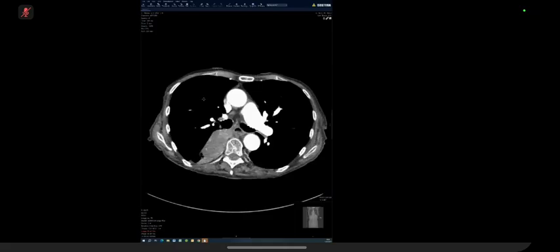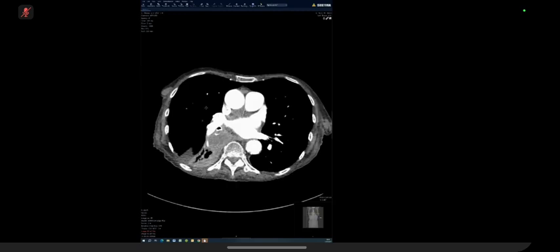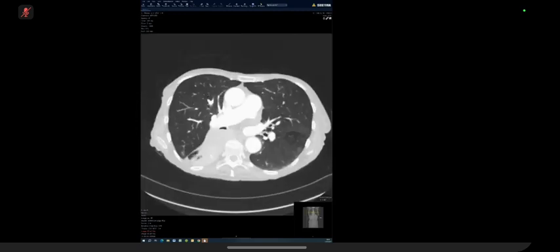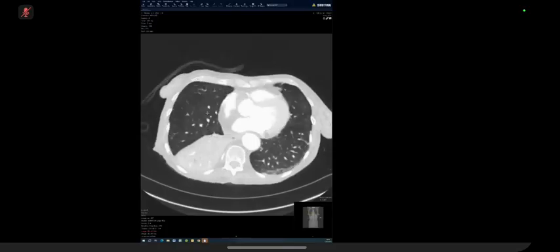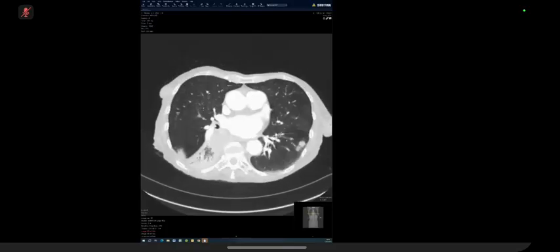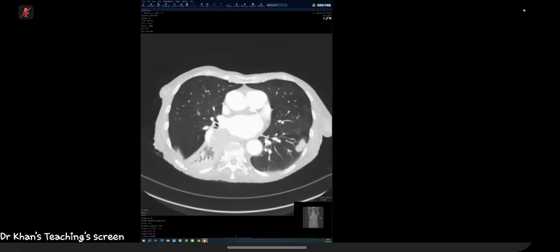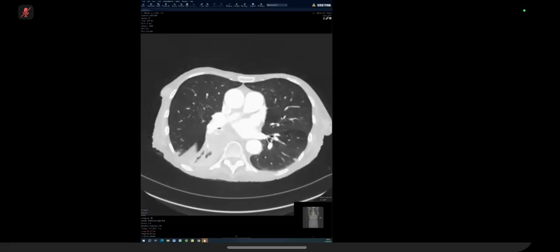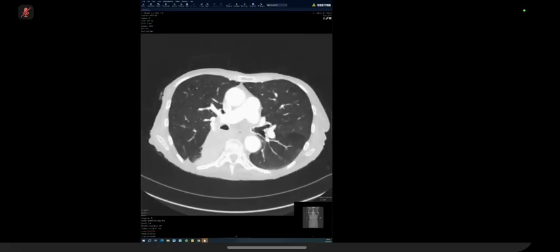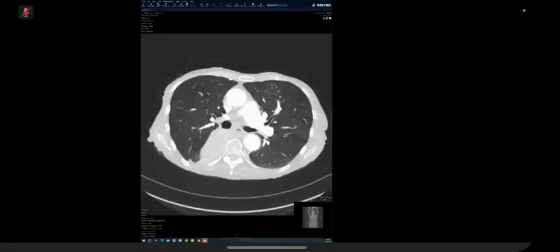So we have spent a little over 7 to 8 minutes, and this is the point where the examiner will start rushing you to get a call out of you and next steps. So give me your conclusion of it, and then I'll go through the case again. Okay. So in summary, I would say that this is a right lower lobe consolidation with a cavitating lesion in the left lower lobe.